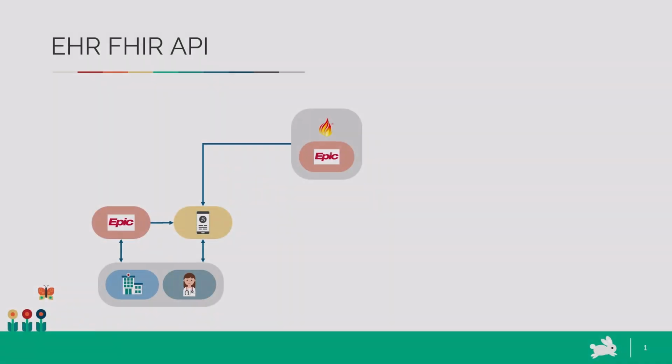The reason I'm using Epic is because Epic provides a sandbox that can be accessed both as a patient and a provider. So it gives us a very good way to view some scenarios in the real world. Before we hop into the demo, let me give you a quick overview of the scenario and what we will be doing.